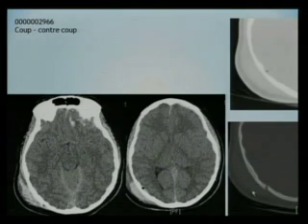It's also important, once you have categorized all the abnormalities, to do bone windows, because you don't want to miss pneumocephalus, no matter how small. Because an intracranial collection of air means that there is an abnormal communication with either the sinuses, the mastoid air cells, or the outside world. So a setup for meningitis, in other words.